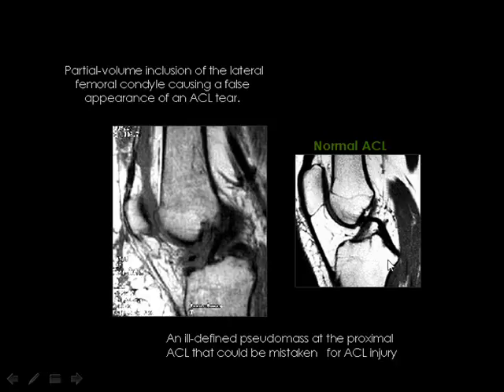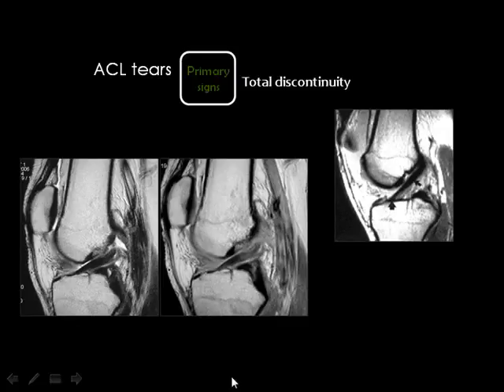Okay. Then this is the normal appearance of the anterior cruciate ligament, and this is the posterior cruciate ligament. And I have said that both ligaments can appear in the same image in some patients, but in other patients you may see only one ligament and the other in the opposite image. Then this is the normal appearance of the ligament, and this is the torn ligament. Why is this torn? Because the attachment to the femur is not intact. And you see at the site of the tear fluid, and the fluid is bright in the T2 weighted image. Then if you see that the ligament is disrupted and there is fluid signal at the site, then you know that this ligament is torn.